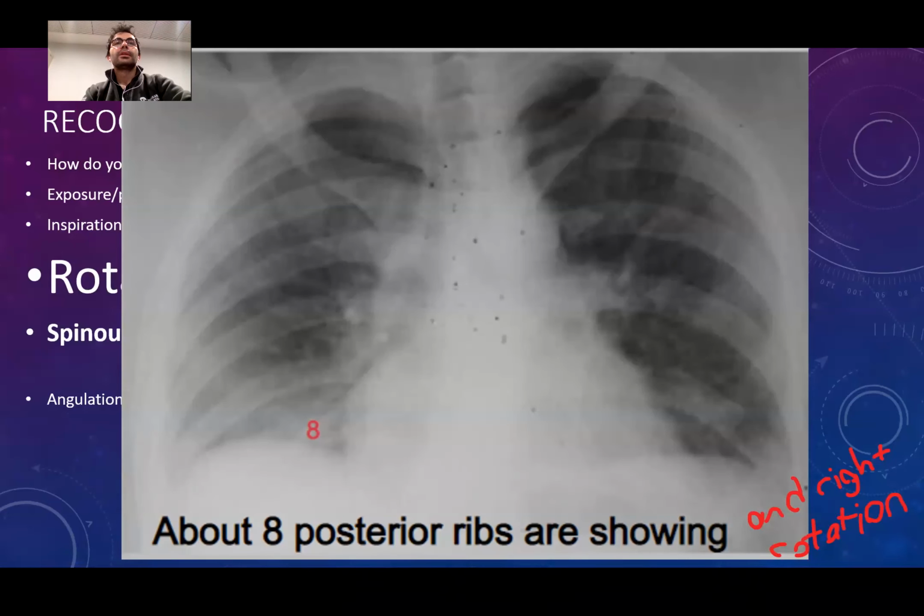Okay. Is there anyone that can evaluate these patients? I'm expecting. Is it a pneumothorax? Definitely not. Where did you see it? Where is the pneumothorax? The apexes of the lung are not symmetrical, but there's a rotation of the patient. The patient is leaning a little bit. Also, there is some asymmetry in the density of the lung areas. So this can be evaluated. I actually put this only for technical evaluation.